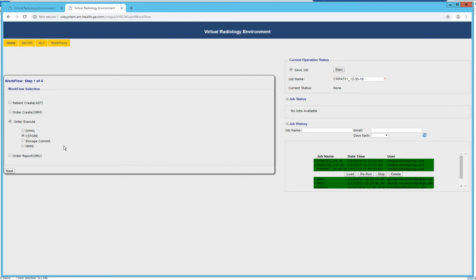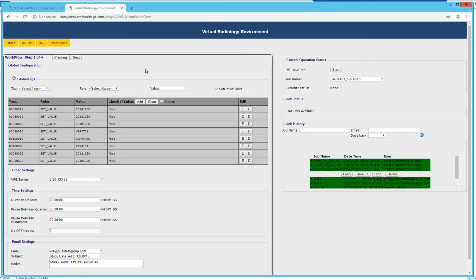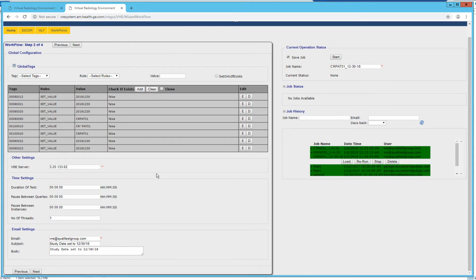Go over here to the left, to the bottom of the section in the page where it says Next, right here where you can see the pointer. If you can see that here, I'll right mouse click as you can see a menu. So click on Next, and you'll notice it has all of these DICOM tags and various settings put here in the page.